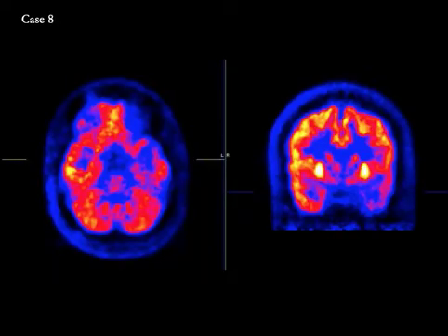Another patient with similar history, we are looking at transaxial and coronal images from FDG PET-CT study of the brain showing left temporal hypometabolism consistent with presence of a seizure focus.